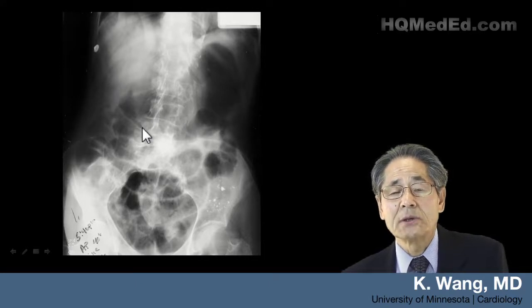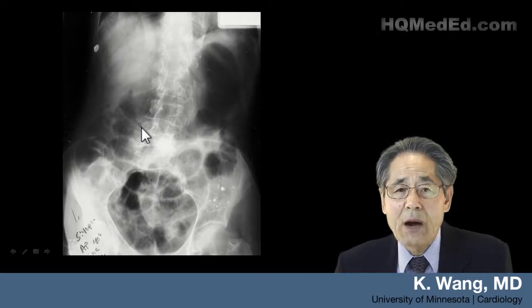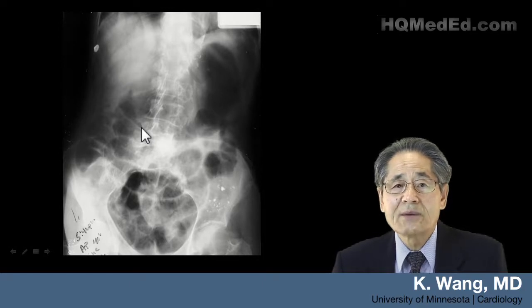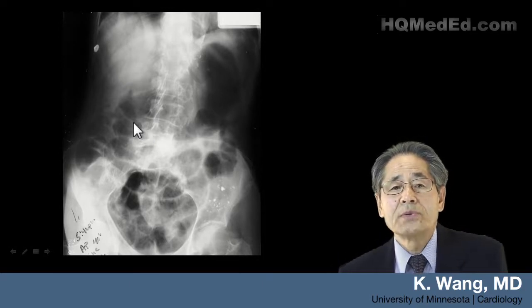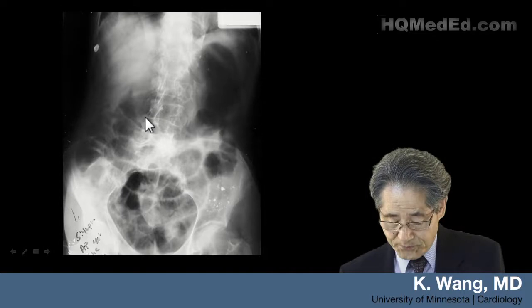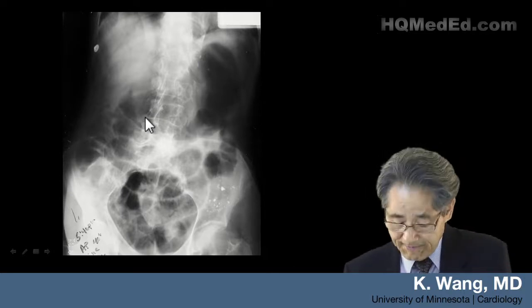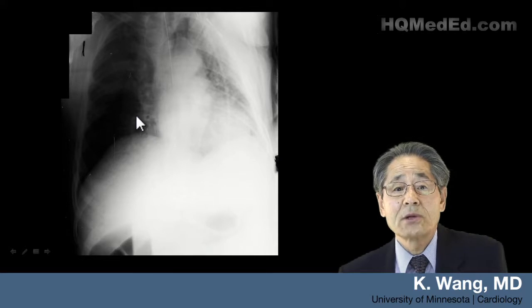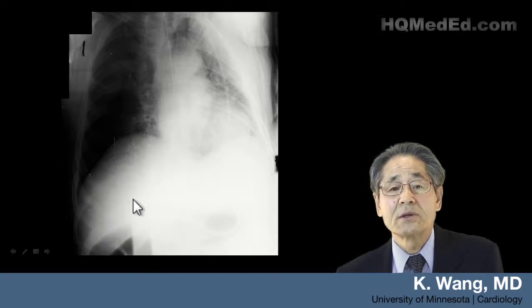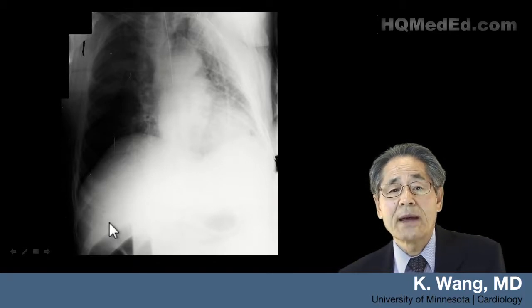Massive bowel infarction. Supposedly, with massive bowel infarction, the oxygen released from oxyhemoglobin due to low PO2 is causing this air in the liver. Diagnostic of massive bowel infarction. From another patient, you can appreciate the fine network of air, not as clear as the previous case, but this again is another case of massive bowel infarction with air in the portal venous system.